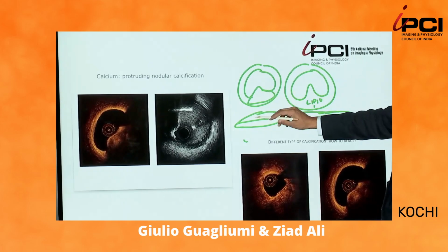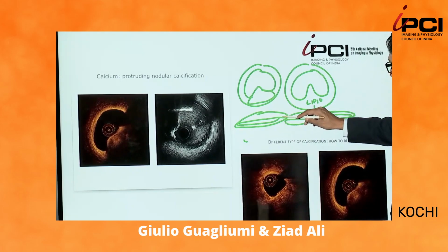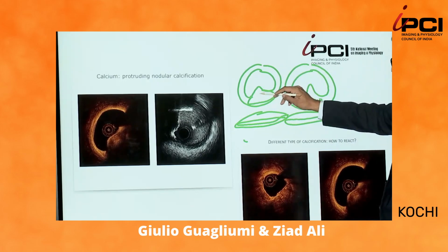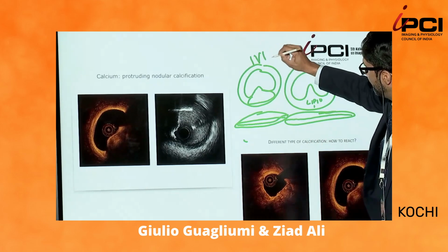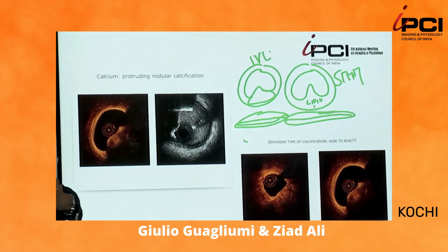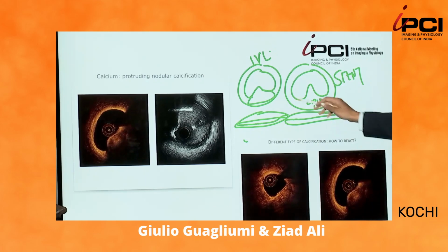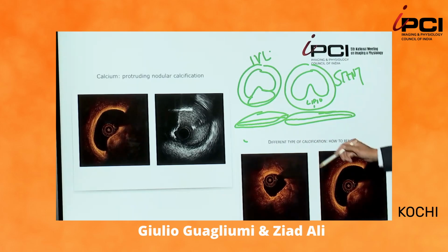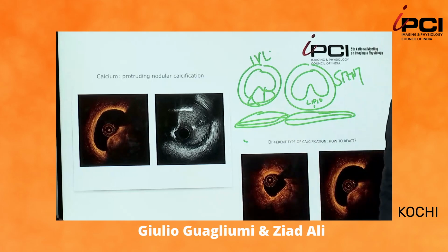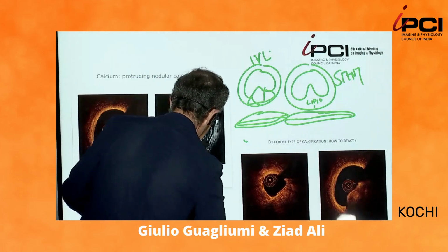If you have a heavy wire bias towards the lesion and away from the balloon, towards the other side, this is calcium. This is IVL. This is stent. Make sense? If your nodule behaves on top of lipid, you can push the marble into the plaque and into the lipid. But if your marble is sitting on top of rock, it will never expand. So we have to crack the rock. And actually the IVL works at the edges of the marble, allowing you to facilitate movement.